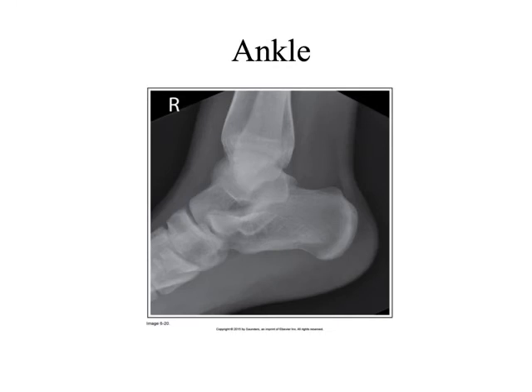Okay, lateral ankle. Looks a lot like that lateral calcaneus, and we do these quite a bit in surgery. Mainly what we're looking at here is that long axis of the leg. We want to see how the tibia and fibula relate to the joint space itself.